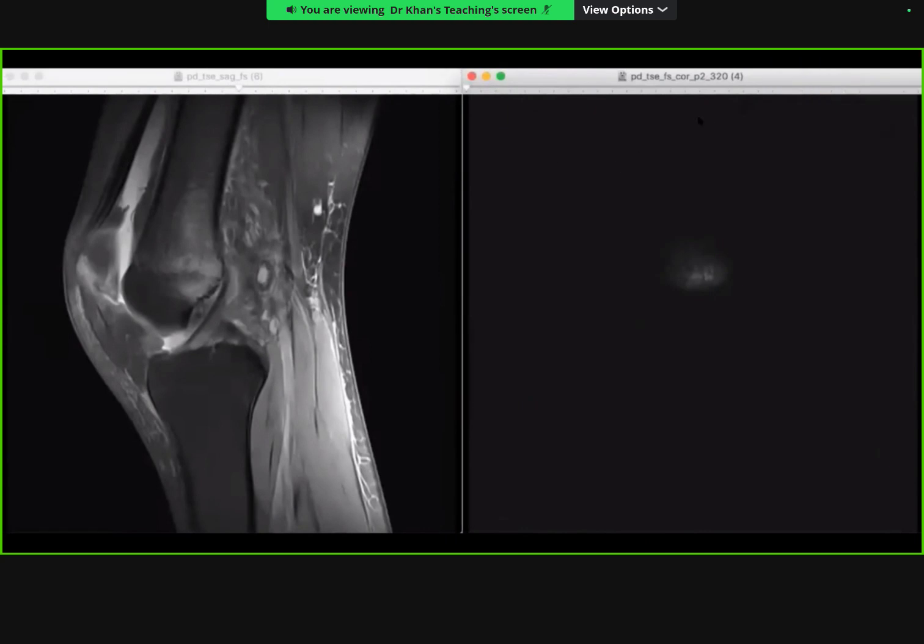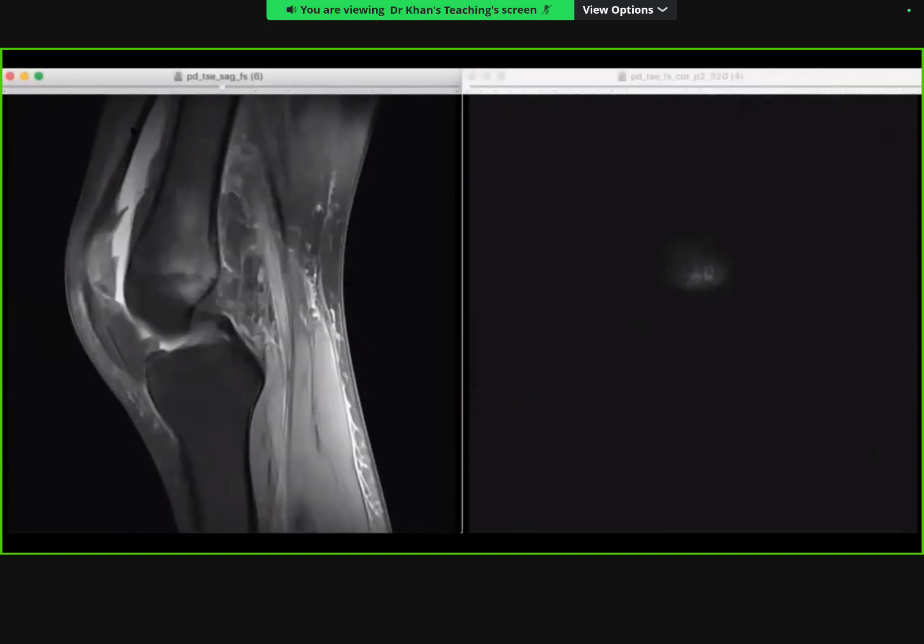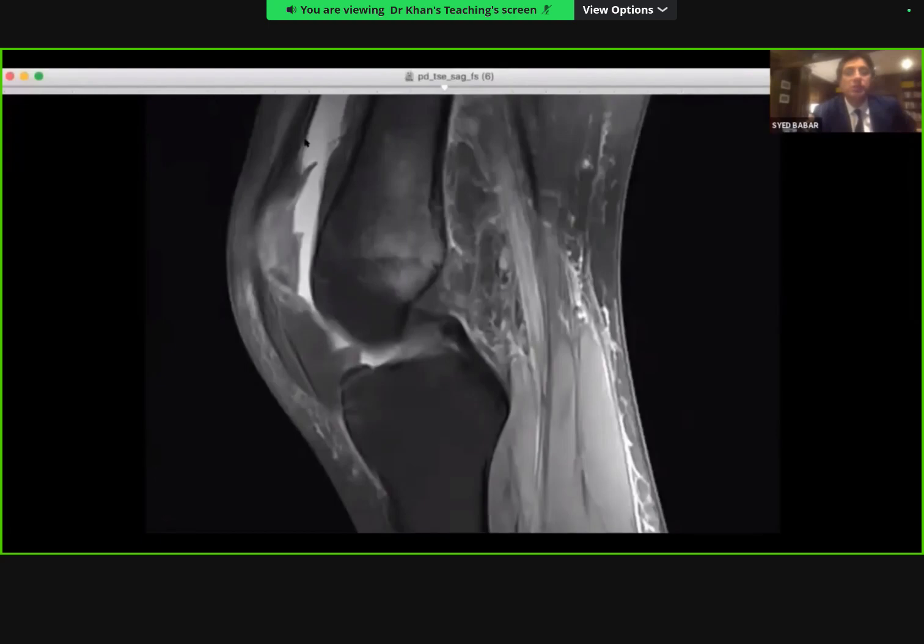Sorry. We can go back and can you see a little orange revert button? If you press that, it'll go back to normal. Yeah, that one. Reset. Top left. This one? Oh, hang on. Here you go. Oops, that's disappeared.